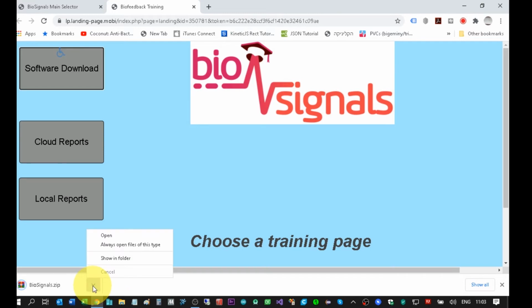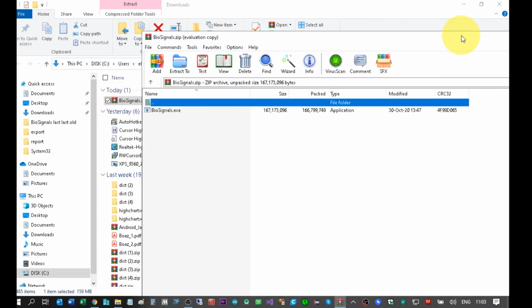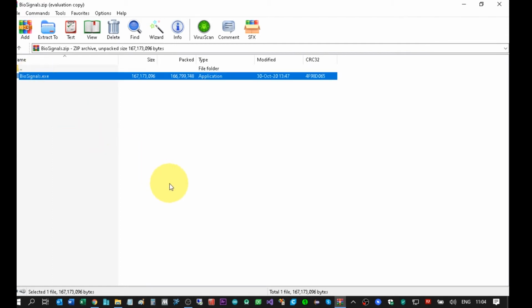Okay, I will go to show in folder. This is the file biosignals.zip. Double click on this, and I will run it from here. I will do a double click, and let's follow the installation step by step.